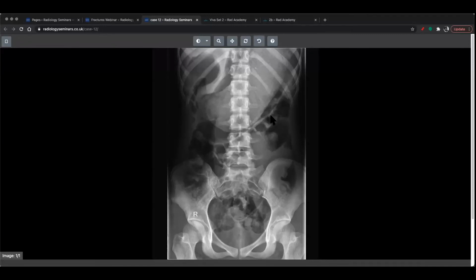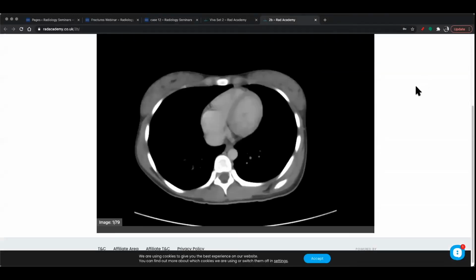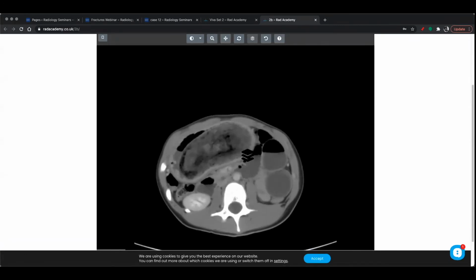Yeah, one twin was eating the other twin's hair. And that ended up resulting in stomach pain and a small bowel obstruction. Exactly right. So if you look at the CT, hopefully you guys can see it, but if you scroll through, you can see that this follow-up CT scan of this patient showed this big, big hairball.